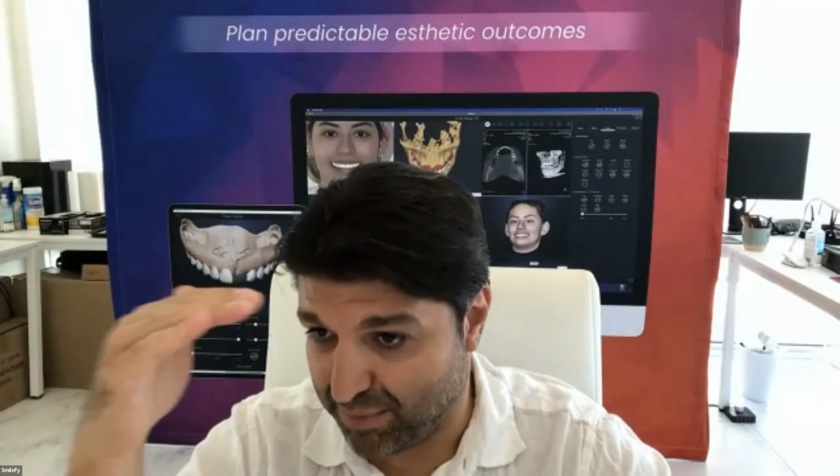If you want, for example, to use Emax and to press veneers based on our design and our natural templates, then you use Asiga. Very, very precise print, very accurate. The quality is the highest possible, and then you can print the veneers with the special resin, and then you can press them.